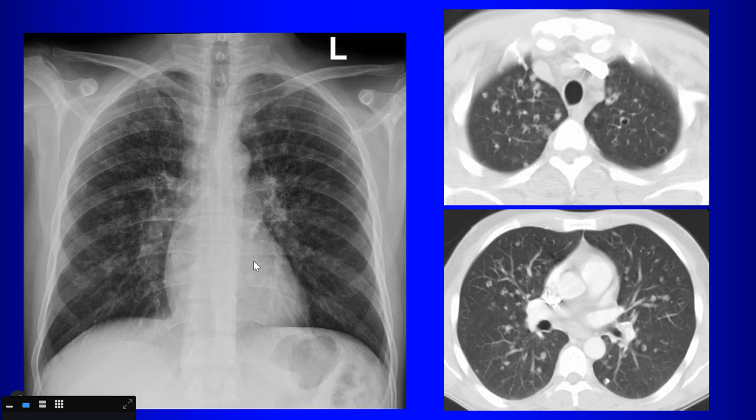So acute exposure to a large inoculum will lead to these multifocal nodular-like consolidations or opacities in the lungs, and they can go on to heal with calcification also. Here's an example. You have multiple nodular opacities, and some of these have gone on to be cavitary. So of course your differential when you see something like this is bronchial spread of TB, bronchogenic dissemination of TB. Yeah, that could be your differential.